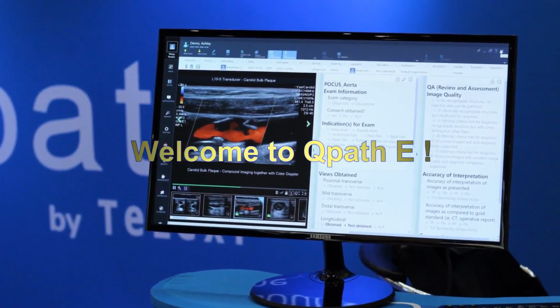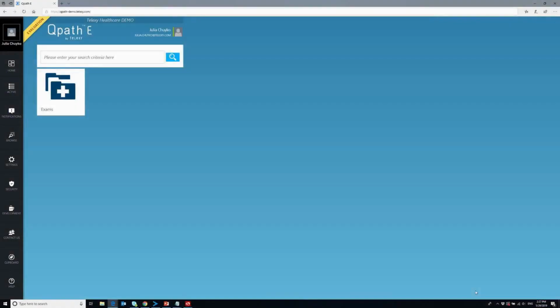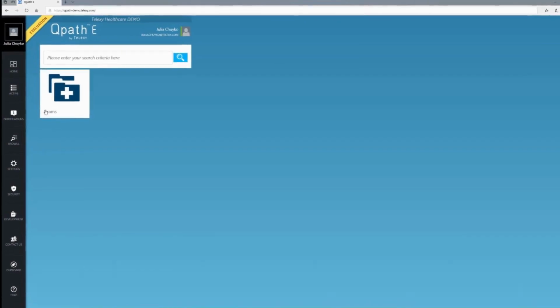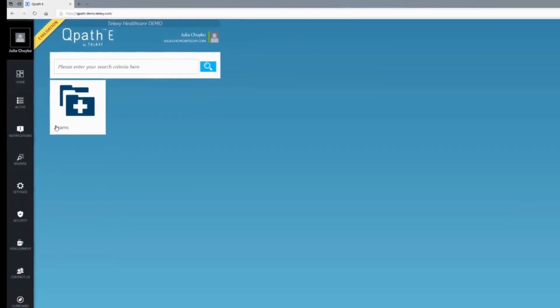Welcome to our Qpath E demo presentation. You are watching our initial video in Qpath E demo series which describes the application desktop and some of the main menu options on the left vertical menu section. Qpath E desktop is displayed on user login. It can be used for pinning application views for quick access. Here you can see a default exam tile which will open all ultrasound exams view.